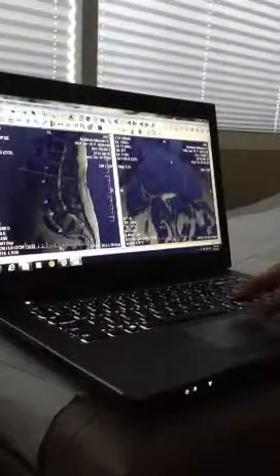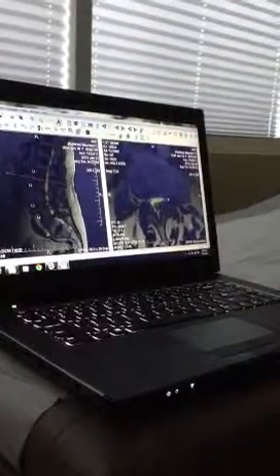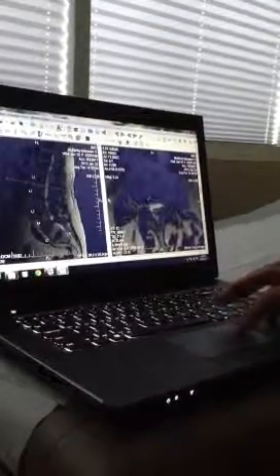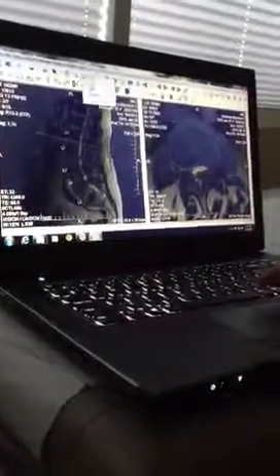And what we're now going to see is the lack of room available for my pointer. Can you see that? Can you see how we've lost that nice concavity or kidney bean shape over here? Can you see how these joints, the facet joints, are larger? And if you want, I could take this off of magnification to make the point more evident to you. No, I can see that. Yeah. If you'd like, I can do that.